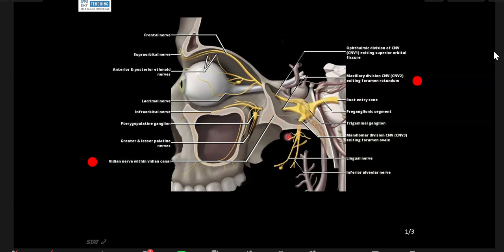And it is a landmark. It can be seen on CT scans and MRs, and pathologies sitting here can go into the cranial cavity through it, and they can go through the cranial cavity posteriorly. So this is the pterygopalatine fossa sitting here. Point to remember is that foramen rotundum, if you see, is slightly more superior than the Vidian canal. So this is a take-home point.